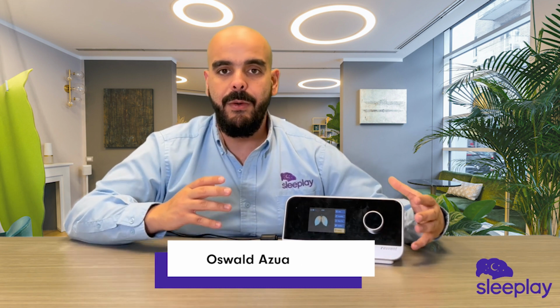Today we're going to be going over the sleep data on the iBreeze by Resvent. Now the iBreeze by Resvent is a great machine. It does provide the standard parameter of the AHI on the screen so you can see where your AHI is. It does have the option for an app that you can get on your smartphone.